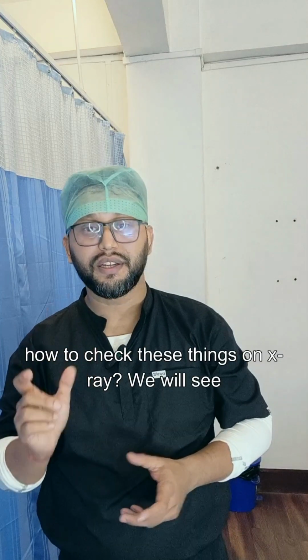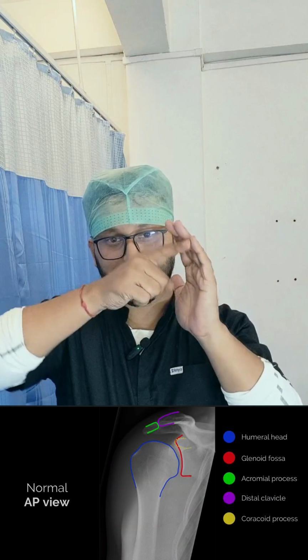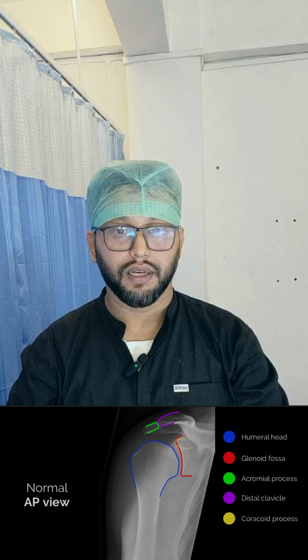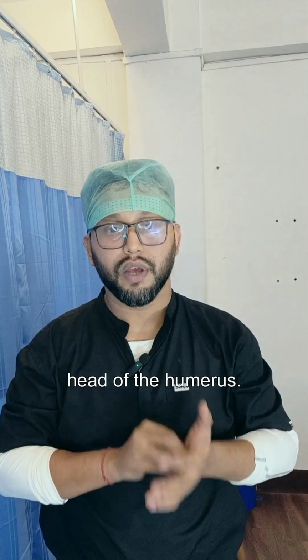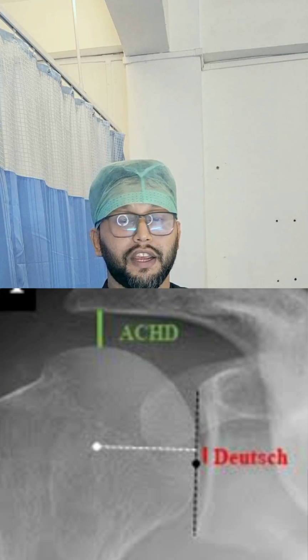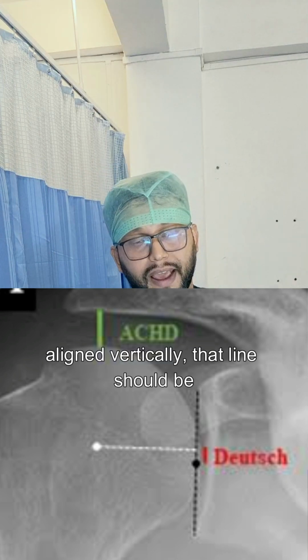Now, how to check these things on X-ray? We'll see step by step. Step number 1, you need to find the glenoid cavity. It's the shallow socket on the scapula. Next, you need to look at the humeral head. It's a round, smooth ball on the top of the humerus. Now that you have marked your glenoid cavity and the head of the humerus, draw an imaginary line through the center of the glenoid and the humeral head. That line should be aligned vertically.